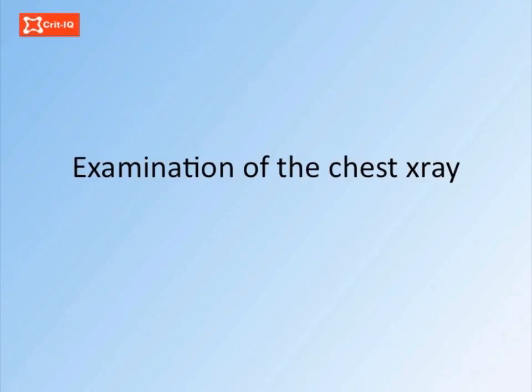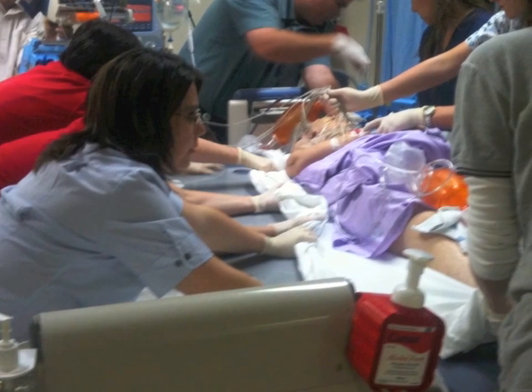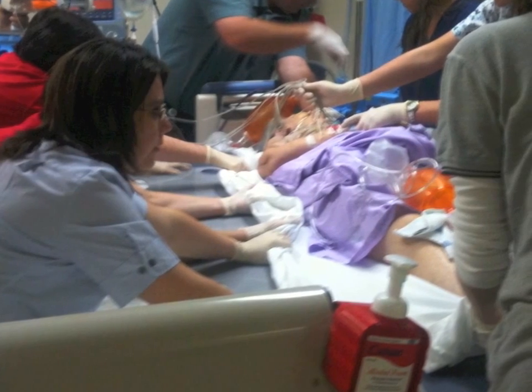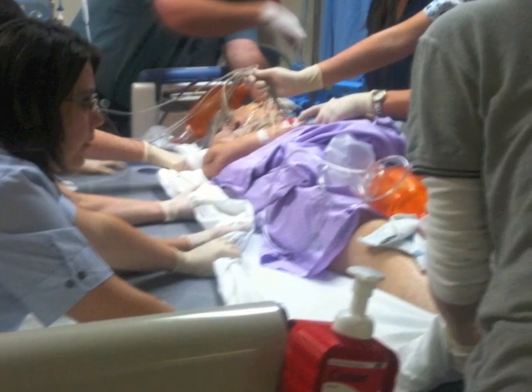Interpreting the chest X-ray is an important skill for all critical care doctors. In intensive care, the X-ray may look quite complex and multiple pathologies may coexist, so a comprehensive analysis is required. The first priority is to check the patient's name, date and time on the film to ensure you're looking at the correct study. It is then important to review the quality of the chest X-ray. Sometimes technical limitations prevent the film from being optimal quality, and this restricts the information that can be obtained.